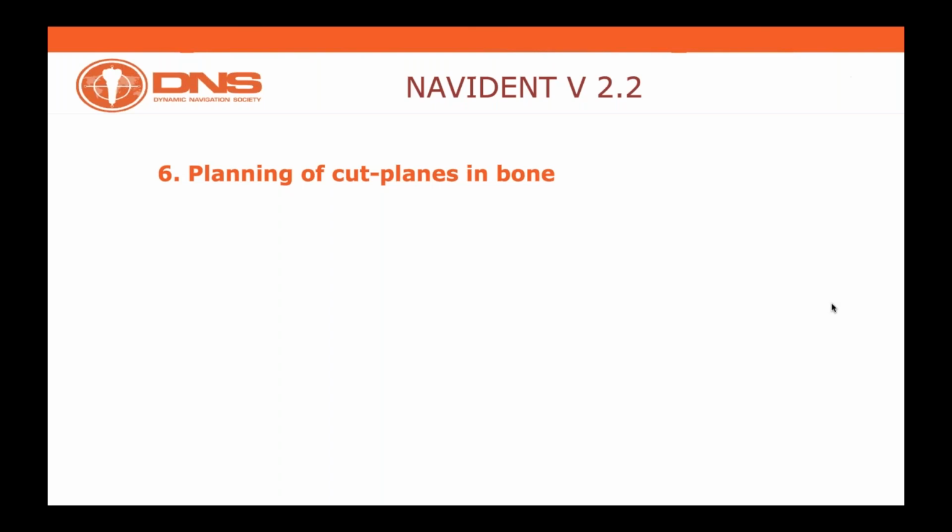So basically, are we able to match the plan with an area of the CBCT? In this case, it is black. It's radiolucent because we took the bone out of the jaw. The question is, yes, that opportunity is there. Nobody has conclusively demonstrated that.